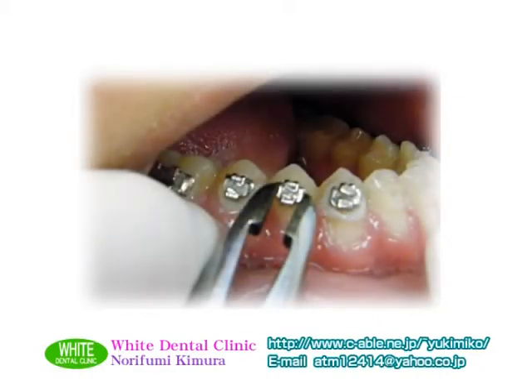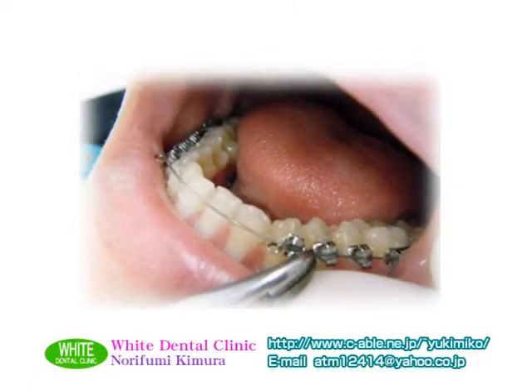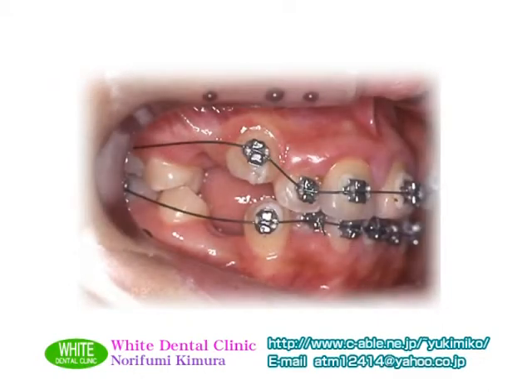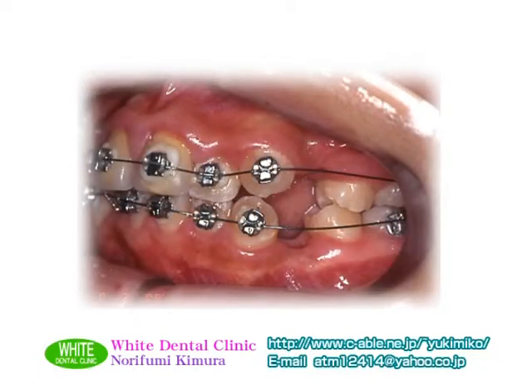It was impossible to determine how much bracket shift is required for the desired premolar occlusion. Also, after reset of the bracket, unnoticed premature contact or slight malocclusion may occur and may contribute to major stresses in orthodontic treatment. Every time the bracket is reset, repetitive polishing and etching may also damage the tooth surface.